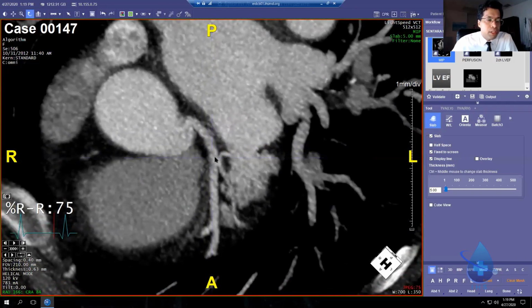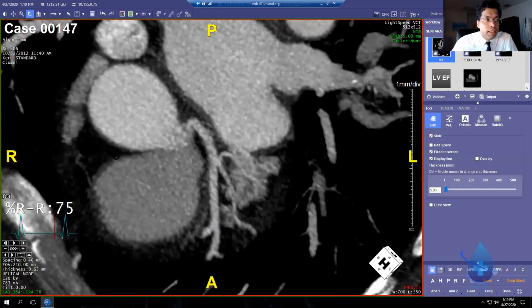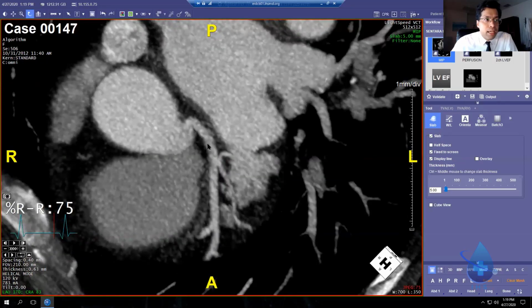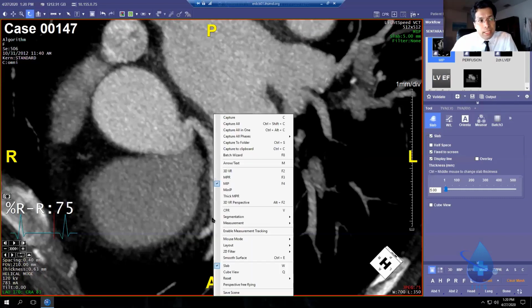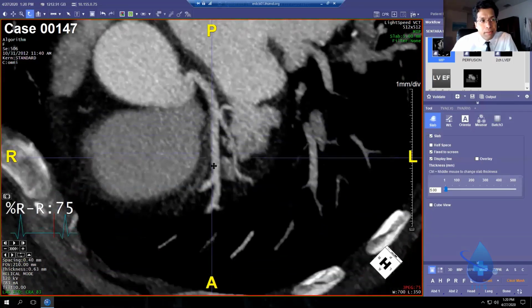So I'm just using those same tools that are in that blue box at the top of the algorithm. So left click and rotate left and right, left 90 degrees and back to the center. And in that way now I have cleared the first centimeter of the LAD of any disease. So now I'm going to right click here and pan up.